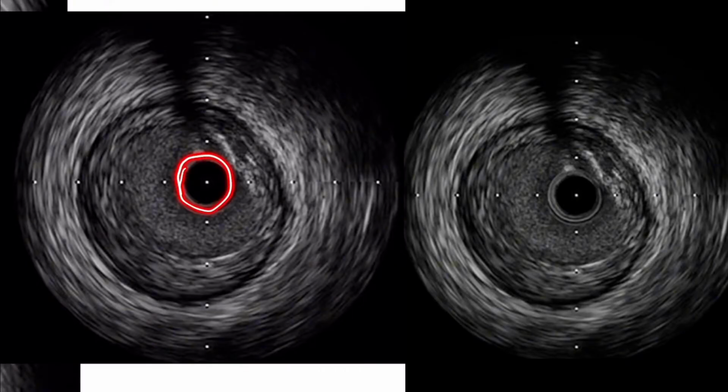So this is the catheter, wire artifact. And then you have a color change, right? From those concentric circles that goes to this gray shading that's all about the same. And then can you tell when this texture changes to a different texture? I hope you can. So look at this texture and then look at this texture. Are they the same or are they different? They're different. This is a little grainier and this is a little blurrier. So that means this is the lumen, and then where that new texture starts, that is what?